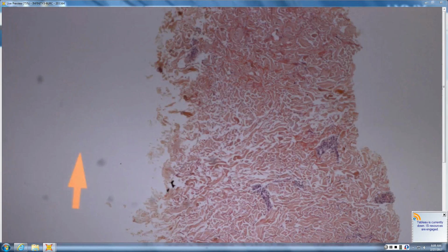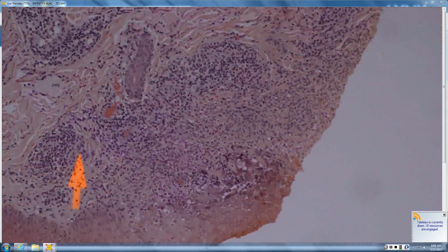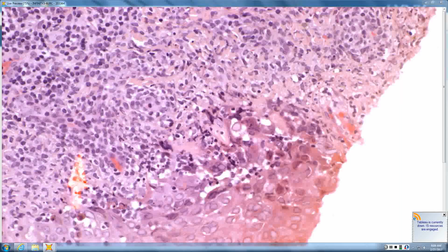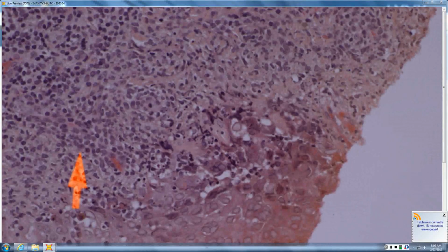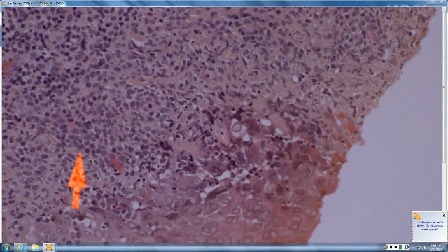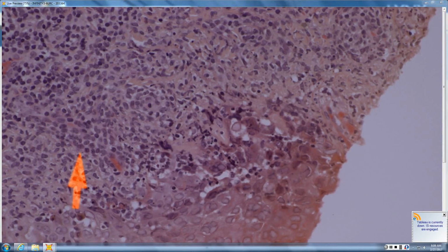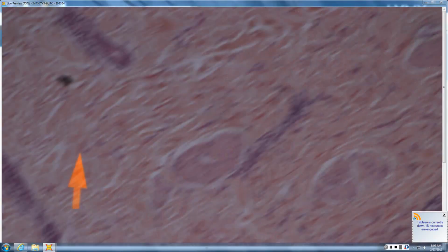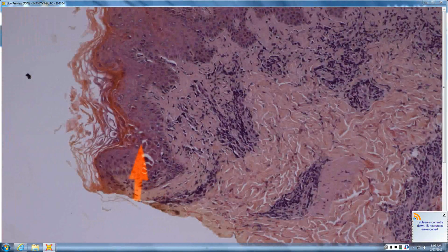It looks kind of wedge-shaped. But there you may have some eggshell. So you have peripheral basophilic eggshell-like chromatin in multinucleated cells with nuclear molding. What are you leading towards? So you're saying that that is herpetic change, but is that the whole story? What else do you see here?